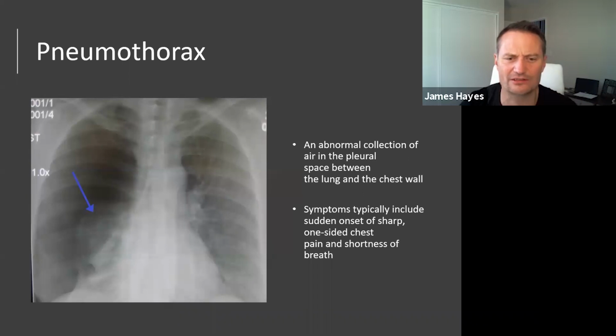If it's a medium-sized pneumothorax like this one, it's actually okay to see because this is your normal lung over here, and you've got all the lovely lung markings, okay? When I say lung markings, I just mean these white lines. So a very small pneumothorax will usually show up here as a tiny little black line, and you've got to really be aware of it. The next day it might have grown, so that's why you've got to be aware of it. But you often don't see it, and it's slightly easier to see the next day.